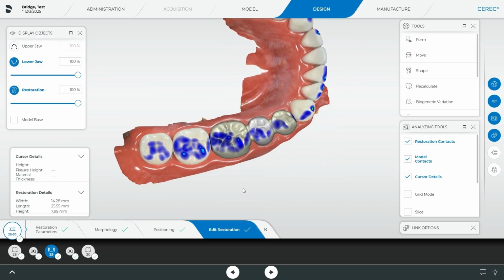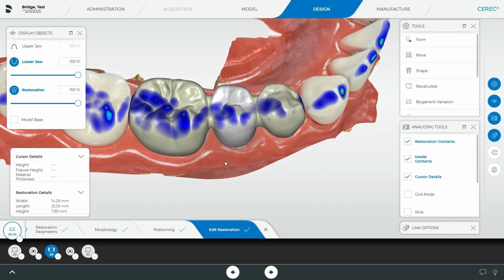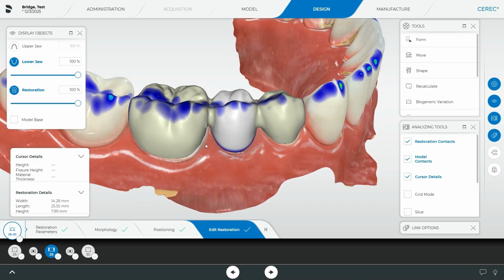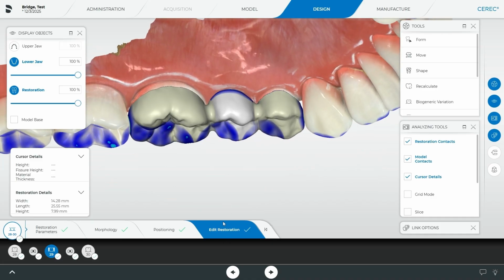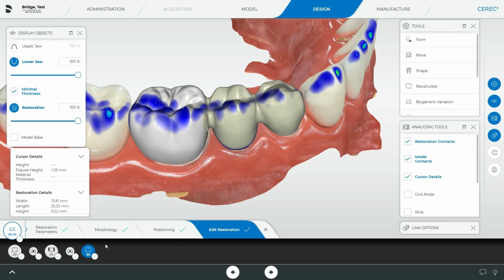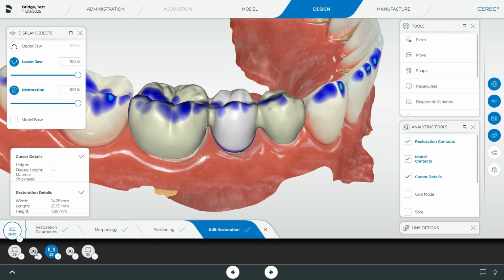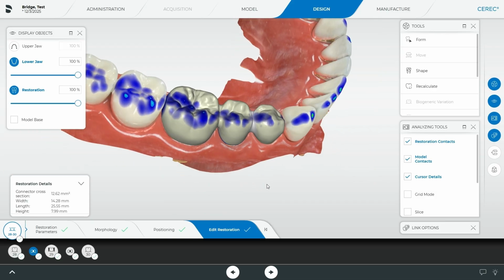It will keep all of the design stuff that we already did, but now we have connectors here, and you'll see that the connectors have green check marks. Sometimes they still won't, and I'll show you how to deal with that. But we have something that is a piece of the bridge. So 30 is a piece, and then the connector is a selectable piece that you can adjust, and 29, and then the connector for those ones is also a piece.